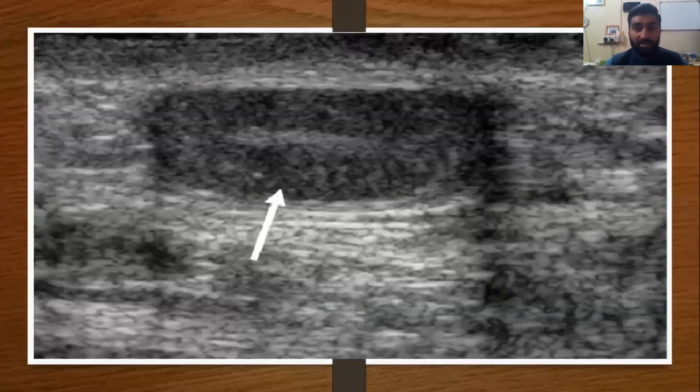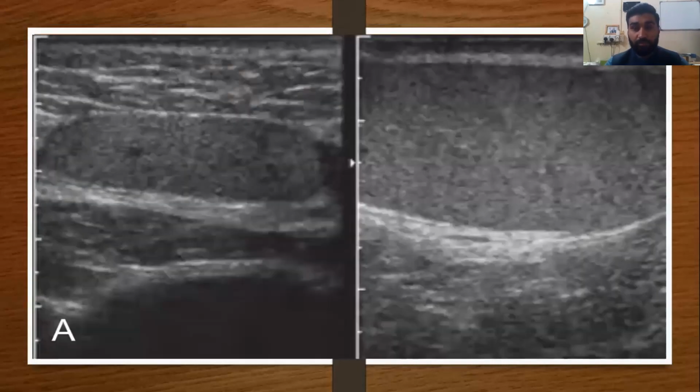One more undescended testis, totally confined and having some mass effect. They cannot grow if they remain in the inguinal canal and can develop a malignancy. And another image of undescended testes, image A is more obvious and prominent than image B.